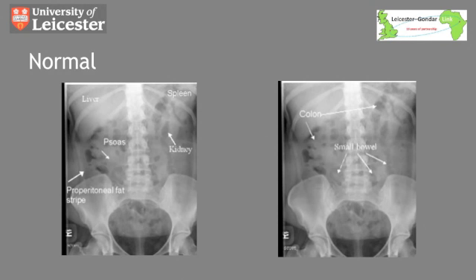The labelled examples of normal x-rays show you the position of most of the intra-abdominal structures. You can see air within the bowel, which shows up black, with denser structures such as the liver and bones showing up white. It's important to remember how much bone can be seen on an abdominal x-ray, as it's not uncommon to diagnose a crushed fracture of the vertebrae or a fractured neck of femur unexpectedly on an abdominal film.